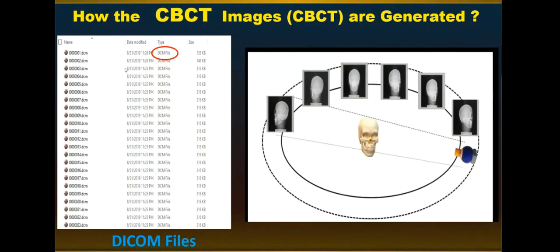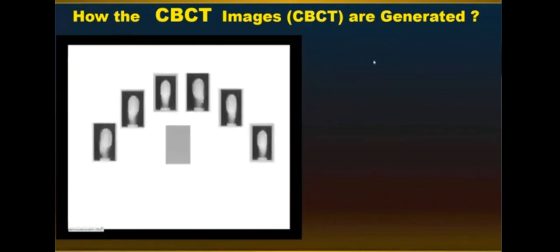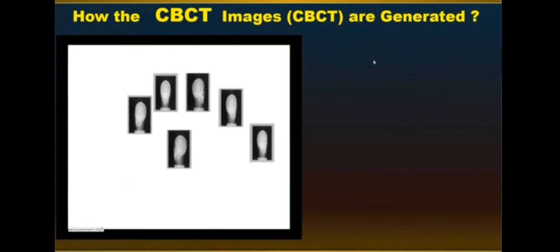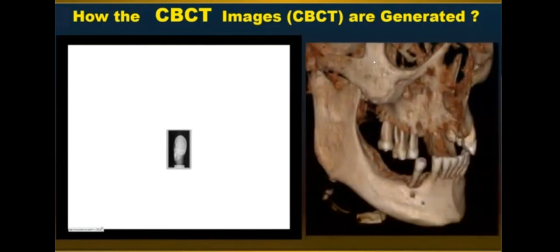So when you use any software, it's very important to know where the DICOM data is. Inside the software, these DICOM data are all collected together, like this, in order to form the CBCT data that we see displayed on the computer.